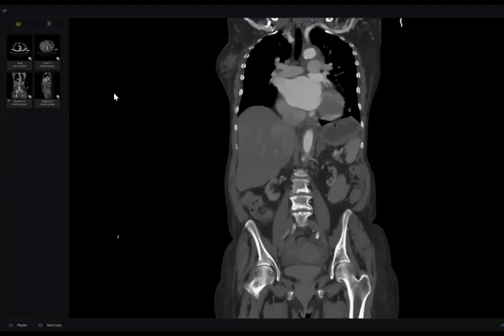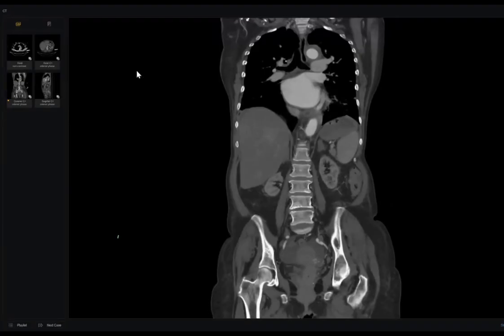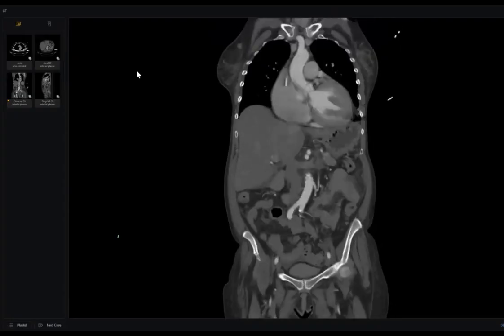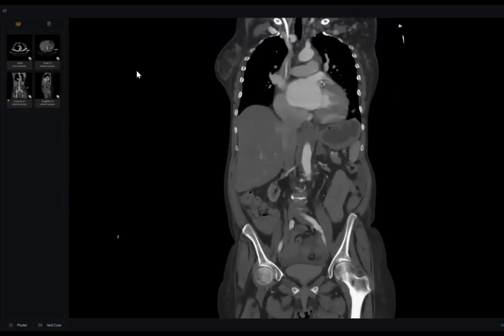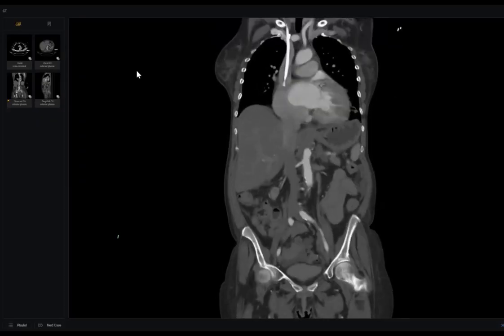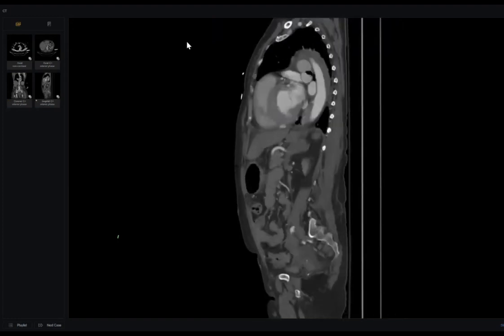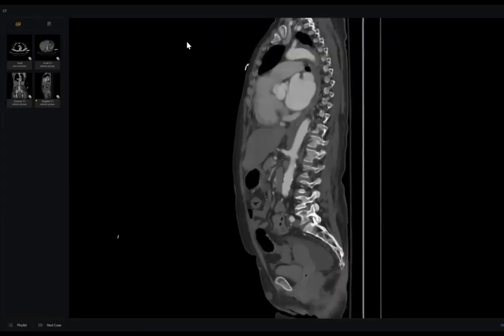I will see, sir, I want to see the extent of this. It is seen at the ascending aorta also. Are you sure? Yes, sir. Look, sir, this is the ascending. See? Yes, sir. Right. Yes, sir, it is somewhat at the mediastinal.